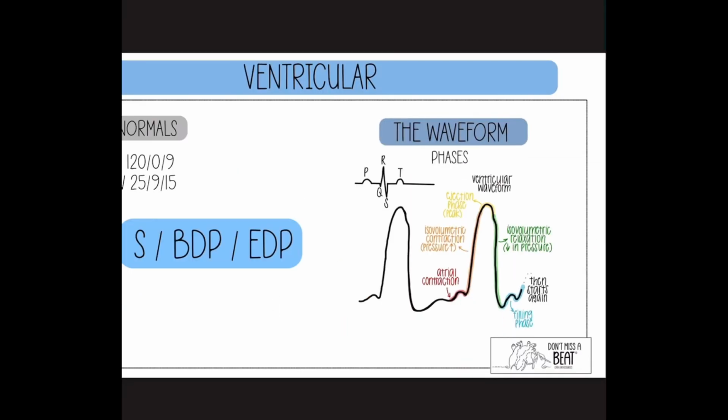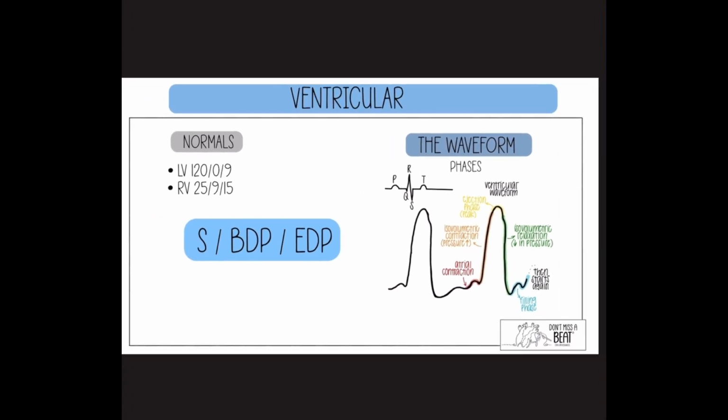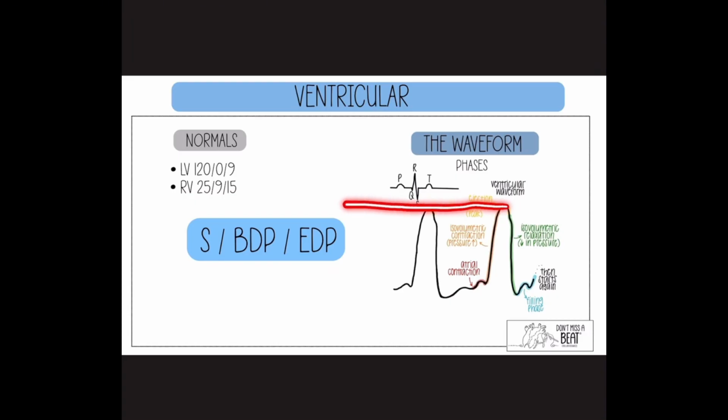So what we are looking at are not these exact phases, but moments before or after some of these phases occur. So systole might be the easiest, right? It's the systolic peak here and or here. Beginning of diastole and end of diastole is actually in the middle here. This is diastole, right? This is systole, this is diastole. So the beginning of diastole is here, and then the end of diastole is here, and then systole starts.